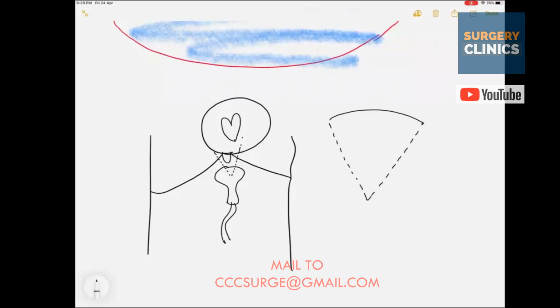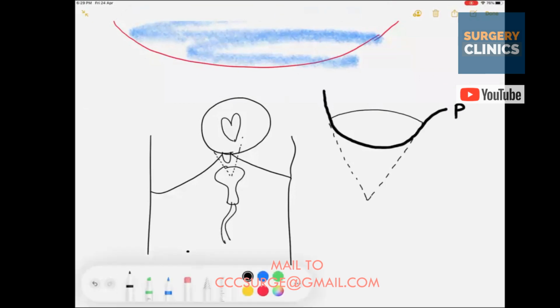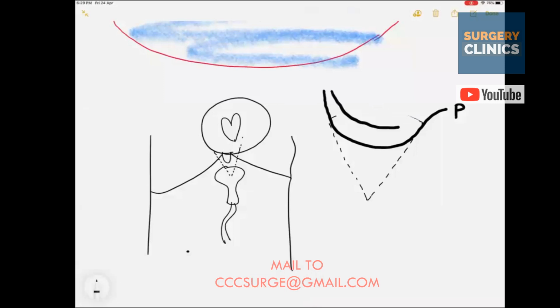So it is very good that you have got interested, because in the next class I will definitely be taking a picture of that. In this one, believe me, you will get to see the pericardium, the P, and you will also get to see the heart and the chambers of the heart.